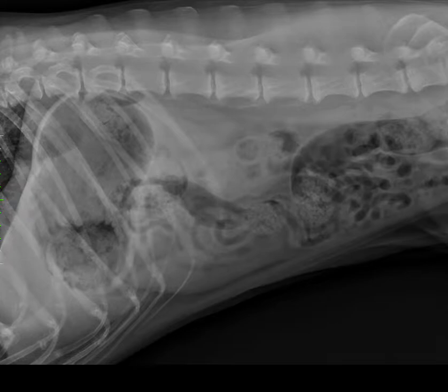Now, when we have a patient with somewhat non-specific clinical signs, and we endeavor to make some radiographs as part of our routine clinical database, I think it's important to go into our radiographic interpretation process with some idea of what we're trying to rule out. In this particular case, I think the goal of the radiographs is to rule out some type of small intestinal obstruction, gastric foreign material, something of that nature.